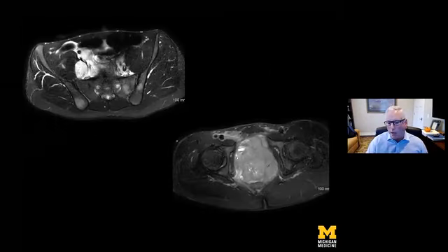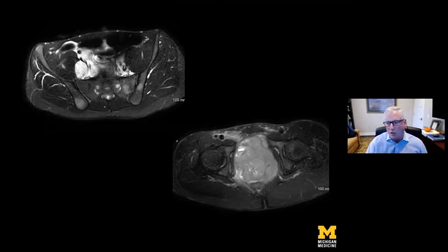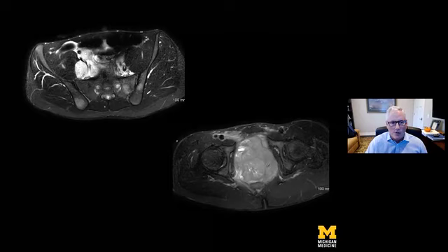Another patient with a prostatic rhabdomyosarcoma, they have cystic change with hemorrhage into the mass. This is the Foley catheter, which is encased and displaced by the mass, which makes sense considering it's prostatic in origin. And we already can see that there are bone lesions consistent with bony metastatic disease. Also, metastatic adenopathy within the right iliac chain.